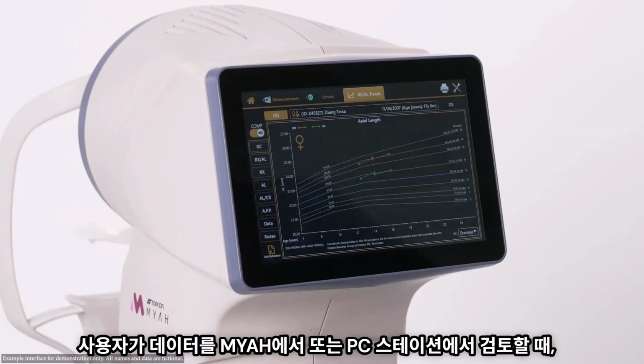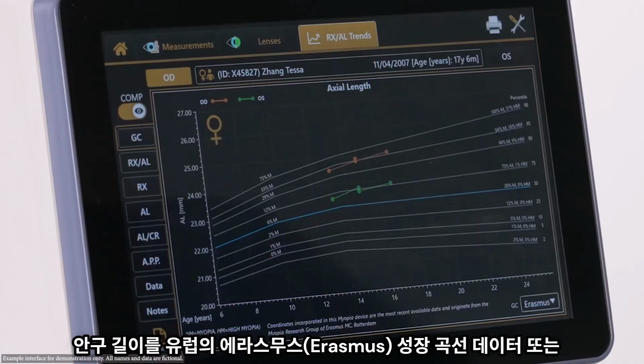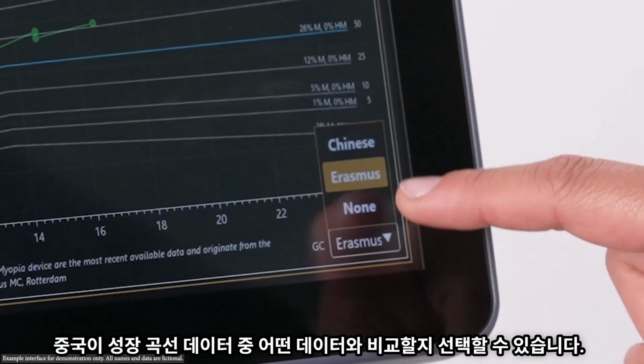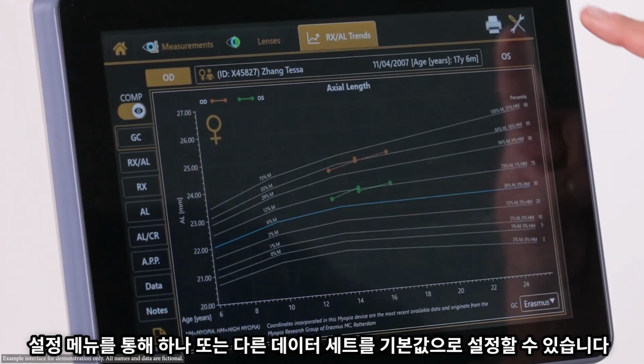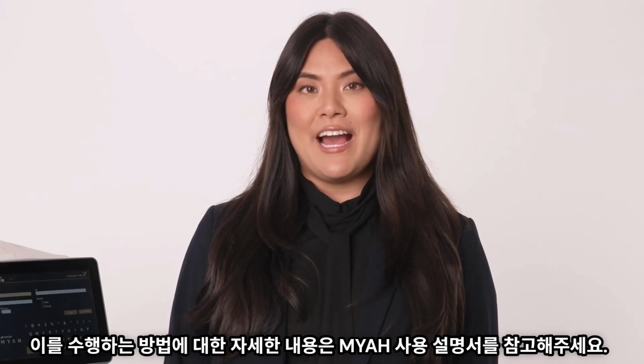Whether you are reviewing the data on the Myah itself or at a review station, you can select whether to compare axial length to the Erasmus growth curves collected on European children or Chinese growth curves. You can set one or the other dataset as the default via the Settings menu. See the Myah user manual for instructions on how to do this.